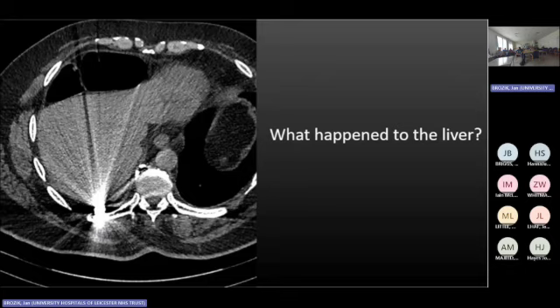And this is CT. That's a superior imaging. It didn't have contrast, but it's the best imaging you can do. Yeah, and I'm going to be a pain and say what you would tell me, which would be, can I have some clinical context to this, please? All right. Yeah, but it was a really bad referral. Just saying that the patient has abdominal pain, and that was it. Really? That's an awful referral. Yeah, I know. Welcome to my world.